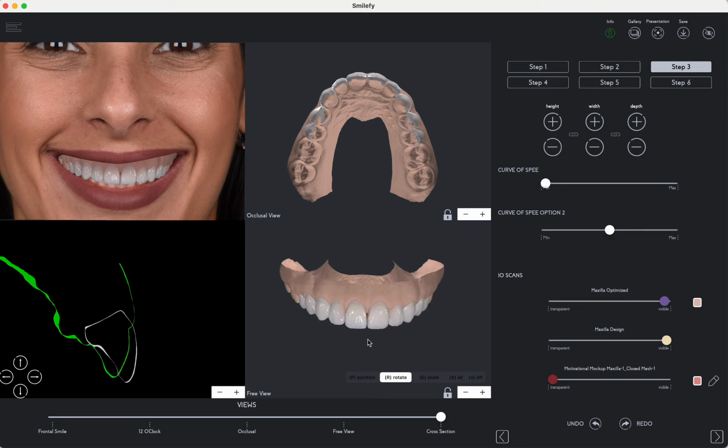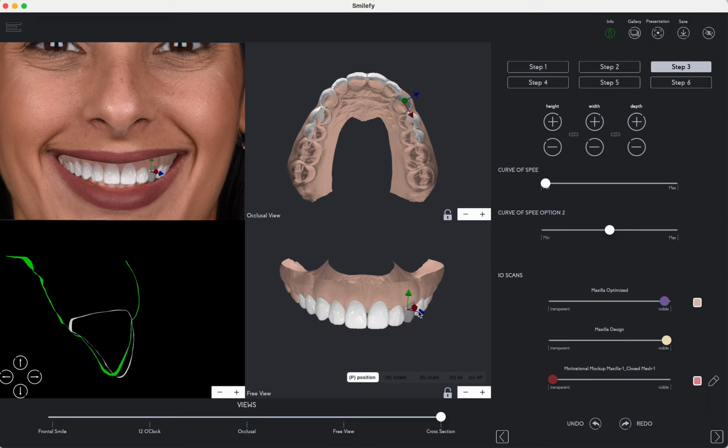in the wrong axial angulation, so there is more ortho treatment needed, or an ortho treatment would be beneficial. Let's say it would be beneficial for the final design. I think that's fine. We can now even correct a little bit the canine like this. I'm way happier than before.